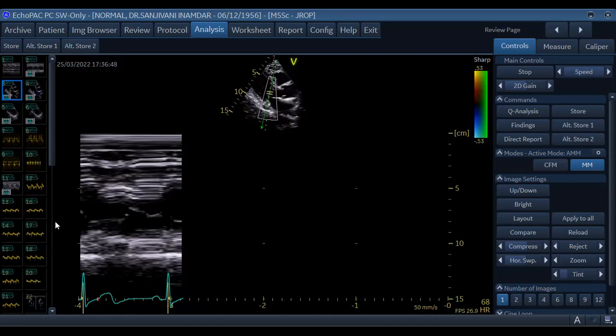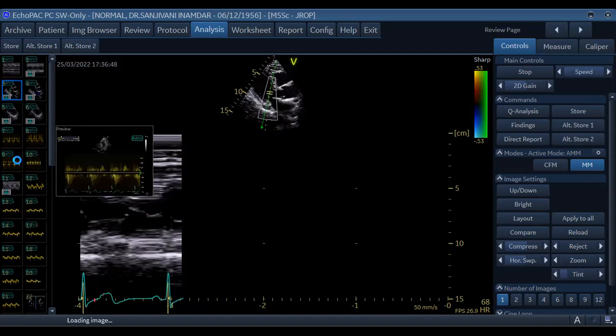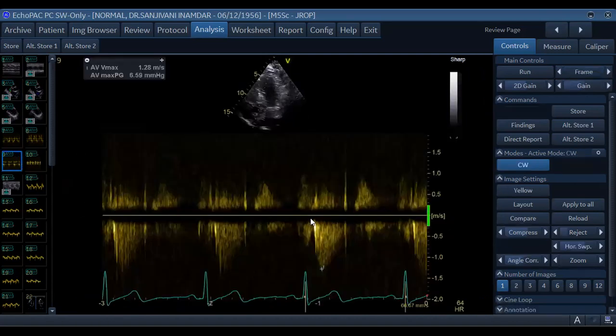Let me just tell you what exactly we mean. If I'm correct, what you're saying is this is what the slope is. If this slope is longer, that means a longer acceleration time. If this slope is quicker, that is a shorter acceleration time. Is that right? Yes, sir.